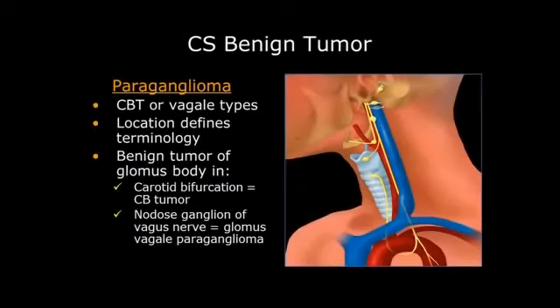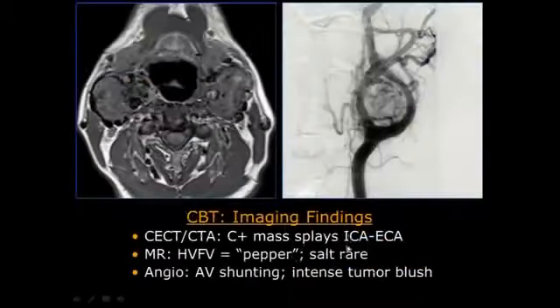And I think we can see all 3. So we have tympanicum, jugulare, vagale, and carotid body here. Classic, these are the ones that we've all seen. They're a very common tumor, especially if you happen to have a family or 2 in your community that grows these things, because there's a familial aspect that they grow them madly and in many places.